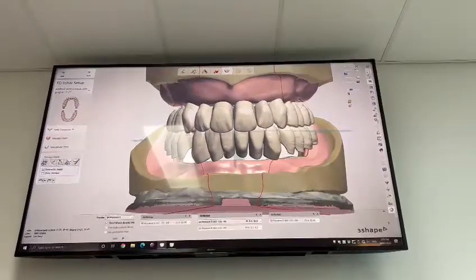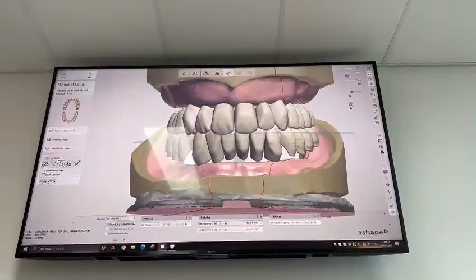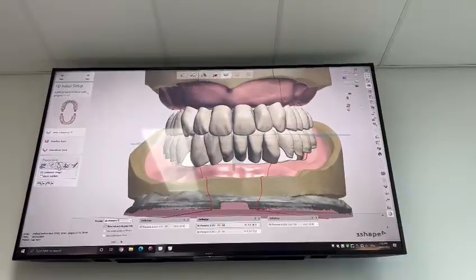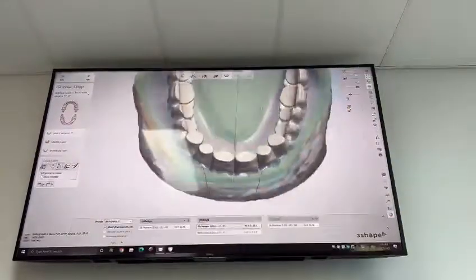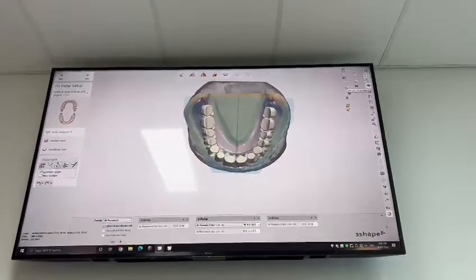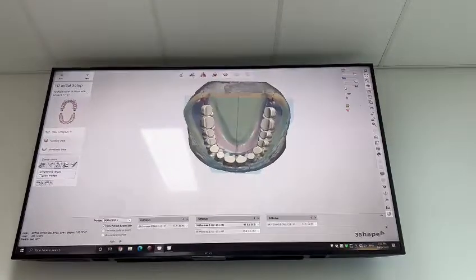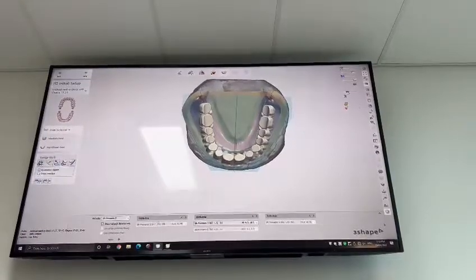I would normally use that for immediate dentures or patients that have something that's very overclosed. So the next point we're going to move to is this third one across. The first thing I do is look: the lower denture needs to be over the ridge to be stable. So the positioning of our posterior lower teeth is probably the most critical part of a functional denture.